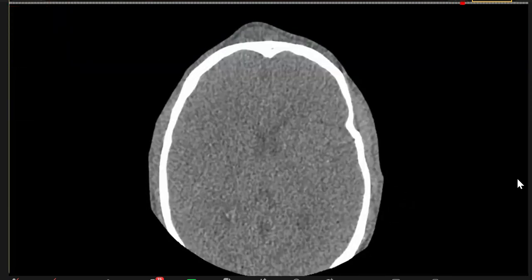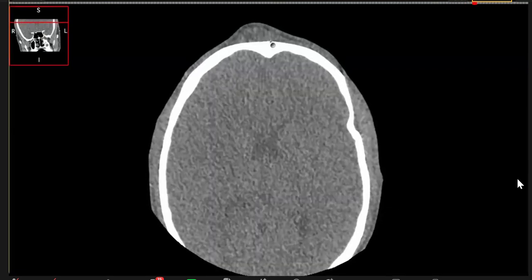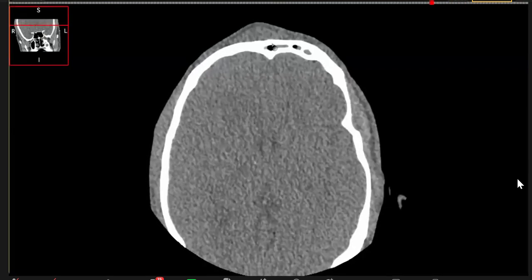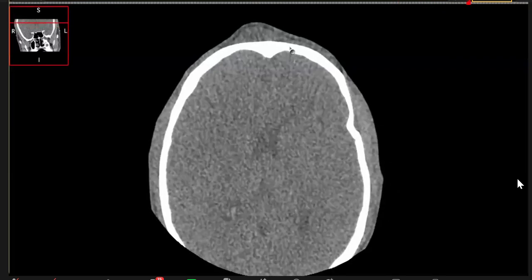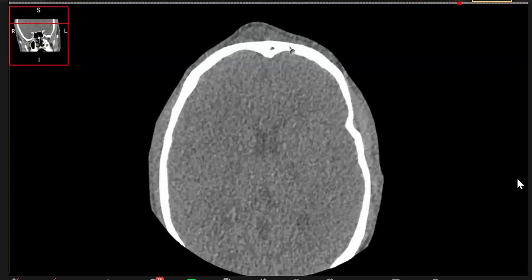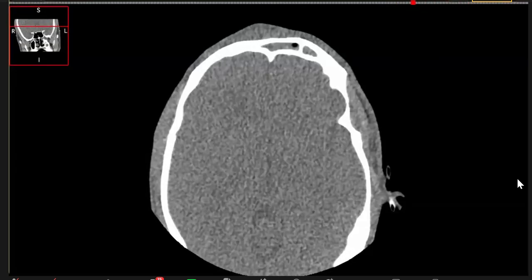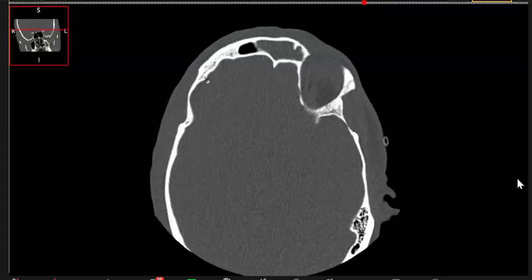One can ask for another window if we see anything, and the examiner might show you a CT with contrast, which was asked, I believe, but of course we did MR in this case, which is fine.